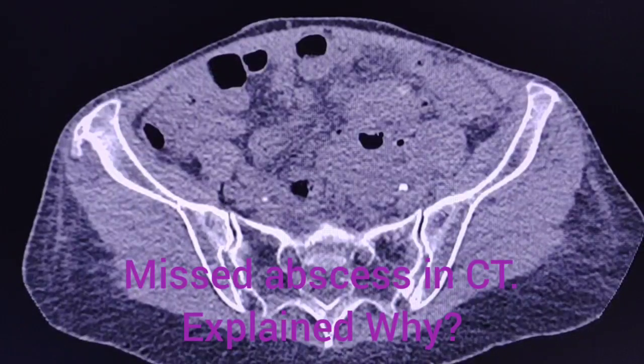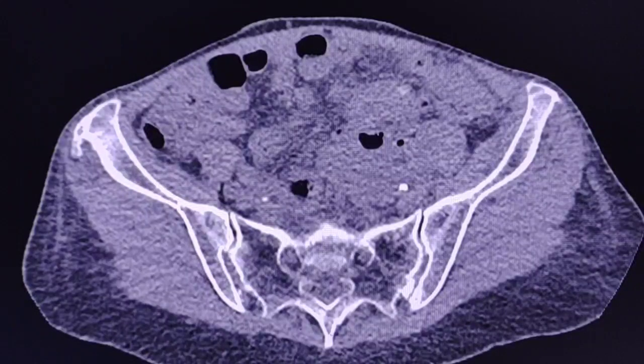Hello dear friends, today I will show you a very interesting case. It is a case of a missing abdominal abscess. This is a 66-year-old woman who presented and was readmitted for severe left iliac fossa pain.